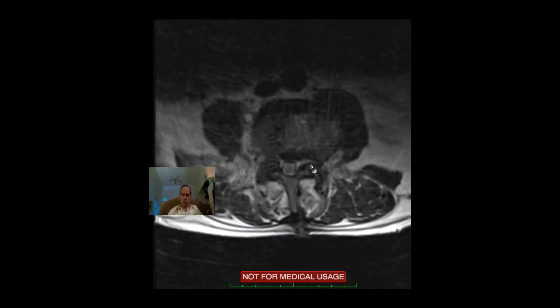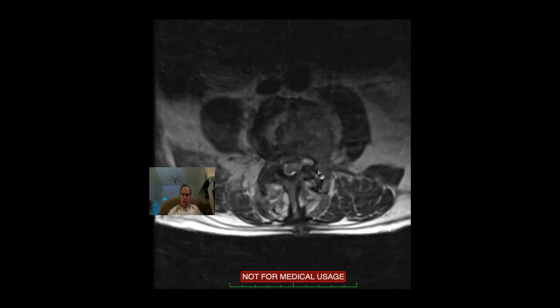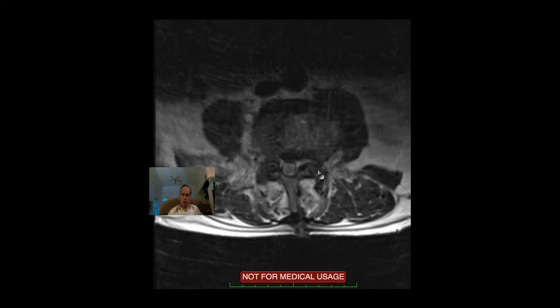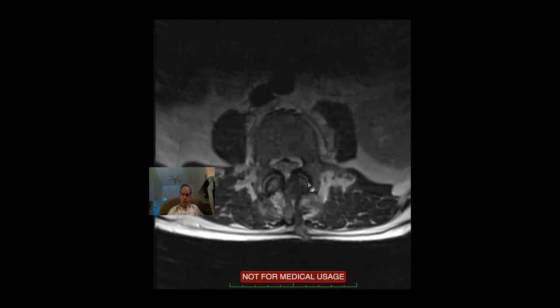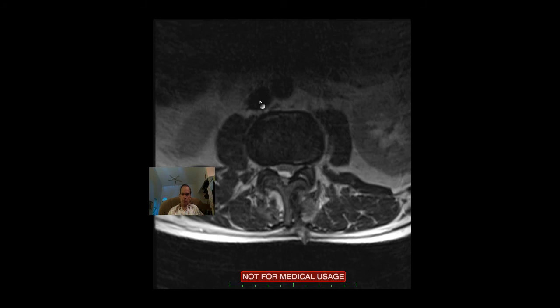You can see the facet joints themselves here up higher. I think that's 3-4. They look quite hypertrophied. They should be really limited to this area here, but they're curving around kind of like a telephone receiver here. And here we are at about L2-3, and this looks much more normal, with even a hint of a little bit of fluid in the facet joints. These are the psoas muscles. Here you have the aorta and IVC.